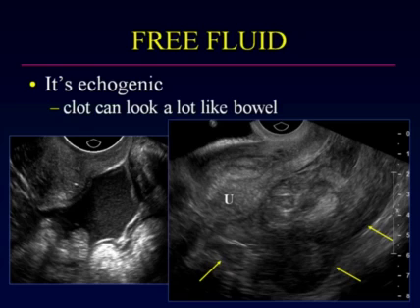It is not bland anechoic fluid. And so it is important to look for clot and echoes within the fluid. Sometimes it's very easy to identify. You can see layering, as you see in this slide on the left. But sometimes when you see internal echoes within the fluid, it may be difficult to determine whether these echoes represent true blood particles, or whether they represent artifact. So it's important to make sure that your gain settings are correct. If you turn the gain up too high, you can create artifactual echoes in all fluid, but if the gain settings are too low, you can lose the echoes from true particles.